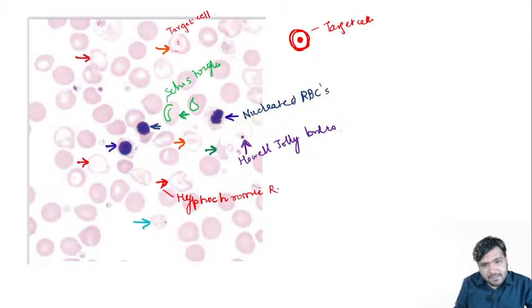Hypochromic basically just pale from the normal RBCs. You can very well appreciate over here, देखो पूरा का पूरा area pale दिख रहा है. Okay, so that is the पूरा का पूरा central area, मतलब majority of the area is pale. So it is the hypochromic RBCs.